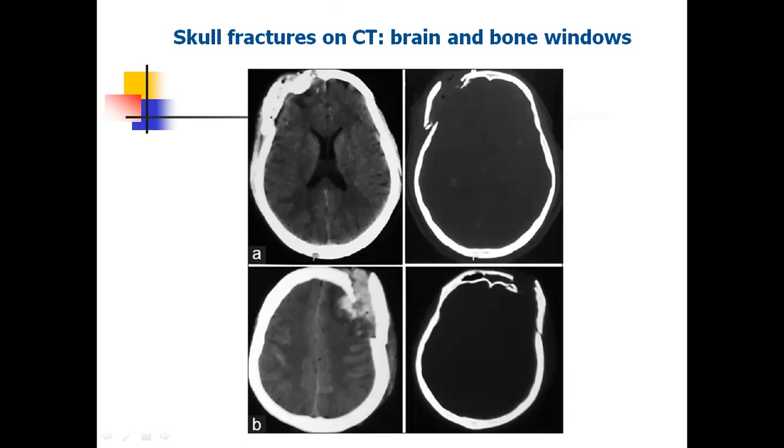Let's observe briefly different syndromes of central nervous system damage. Skull fractures on CT.